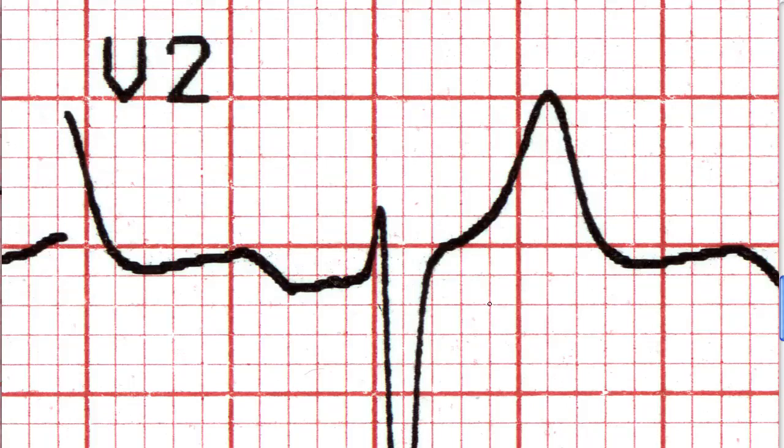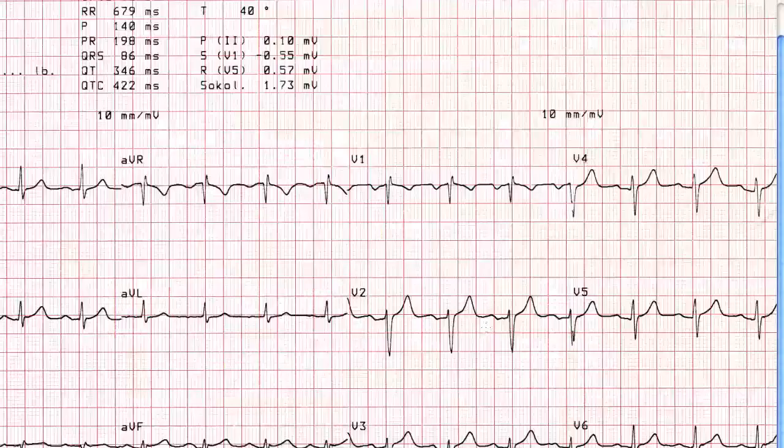So having said all that, let's get back to looking at ECGs as one of the most important tests you can do on a patient with heart disease. And this applies, of course, to cardiac monitors that you'll find on an ambulance, in the emergency room, in the coronary care unit. My purpose here is to make sure you know exactly what you're looking at and get the diagnosis right. Now, what I've shown you here is an ECG that was done on a typical rolling cart type of machine. This machine carries with it pre-printed paper.